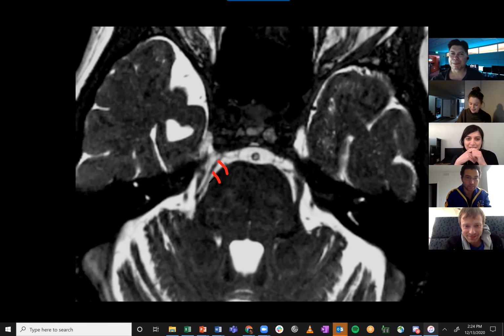So what is this guy? I think that's one of the cisternal fibers of the right cranial nerve 5. Well, that stuff is going over here, and it should be going here through the porus trigeminus, the opening of the trigeminal cistern or Meckel's cave. So let's say instead that the fibers of 5 are coming out here and they're going around this thing to get to the trigeminal cistern.